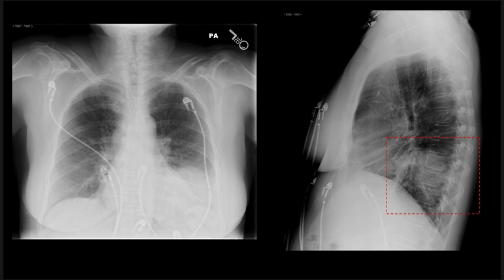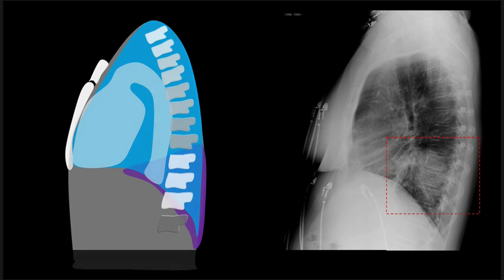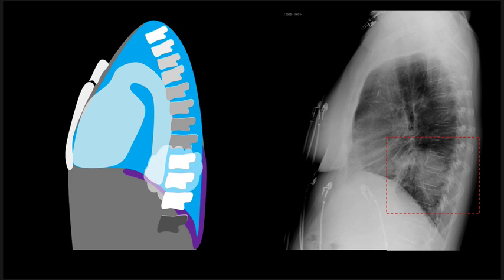And this is another good opportunity to refresh memories about the lateral view. Remember, as we go from top to bottom, there should be an apparent decrease in density. Things appear to get a little bit darker. And if we don't see that, we see it getting lighter down there, that makes us think that there's something hiding back there, right? So this is the so-called spine sign. And we'll talk about that again here in a minute.